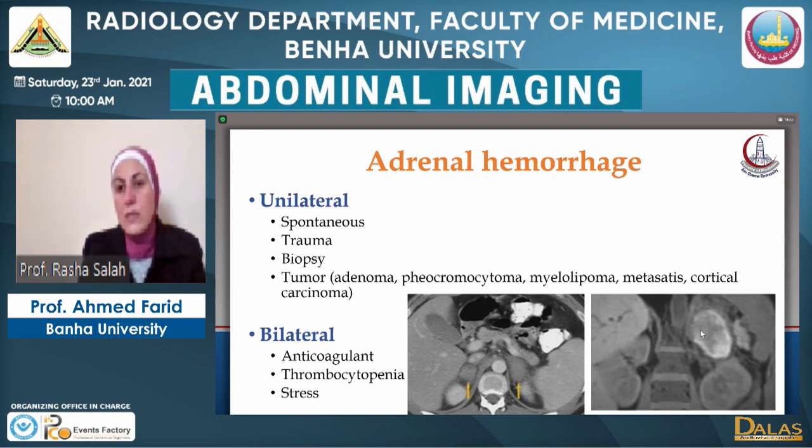and it could happen as a hemorrhagic change in a mass, and then further characterization with the rest of the pulse sequences, and again the signal intensities could be helpful in such a setting, also with the clinical setting of the patient. This is a bilateral adrenal hemorrhage on the CT.